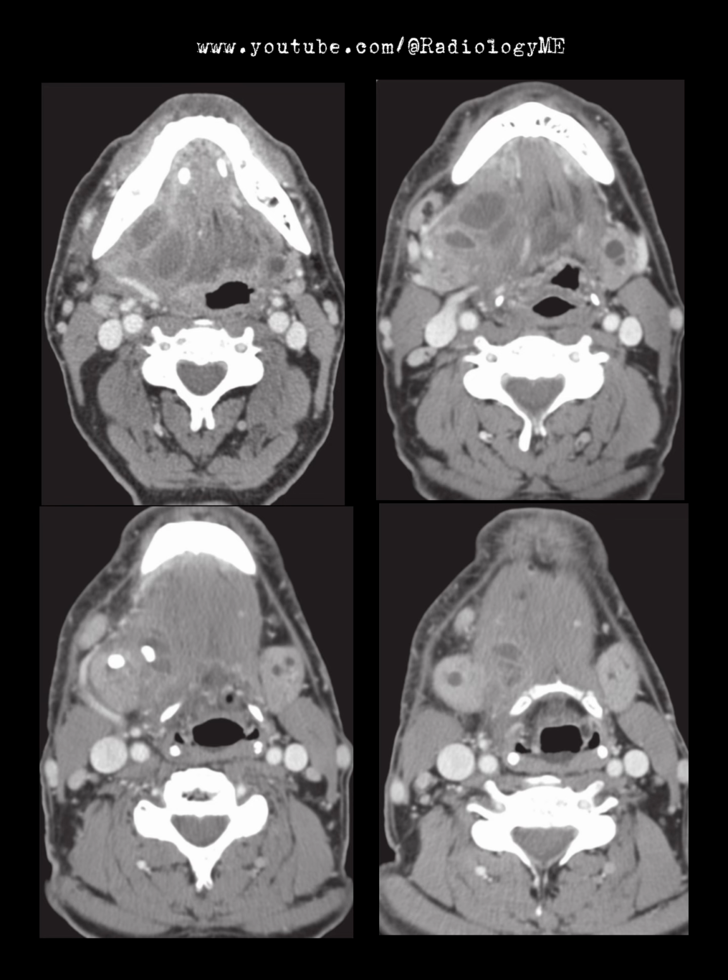So, what we have here are selected images from a post-contrast axial CT scan of the neck. There are a few key abnormalities I'm noticing straight away. In the submental region, there's a well-defined ovoid subcentimeter calcific lesion just off the midline.